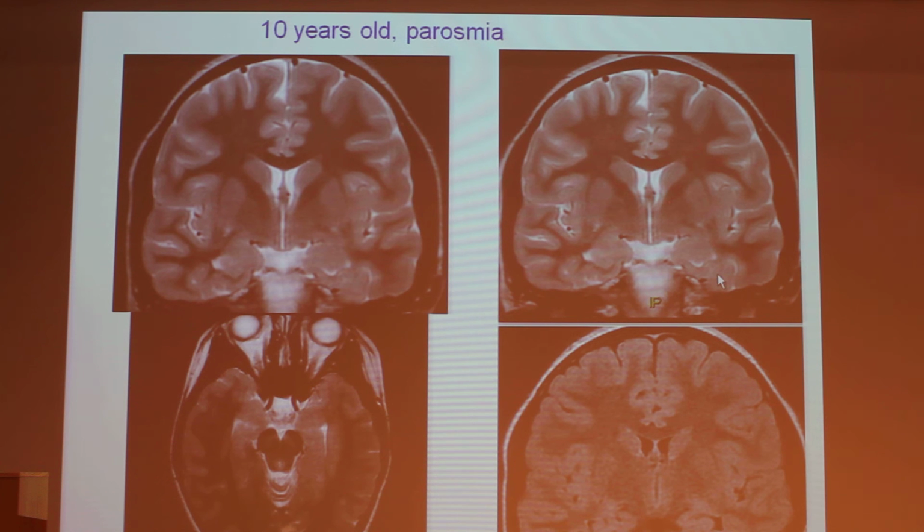A blurring on T2, a blurring on FLAIR, and a very important thing is that in axial plane you don't see anything. So if you made a 3D T1 and an axial T2 and axial FLAIR, and you put it as a normal MRI, we are going to have an intractable epilepsy with 1, 2, 3 treatments, and it is very important to repeat the MRI and to perform the T2 and the FLAIR and to look very strictly at the MRI. Thank you very much for your attention.